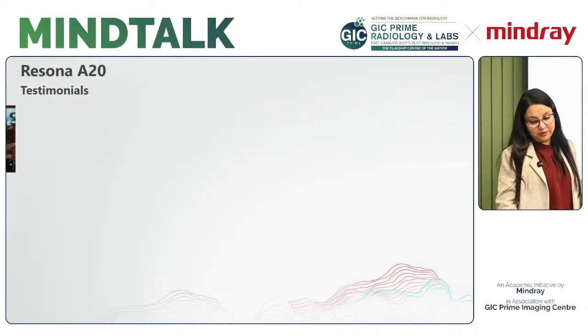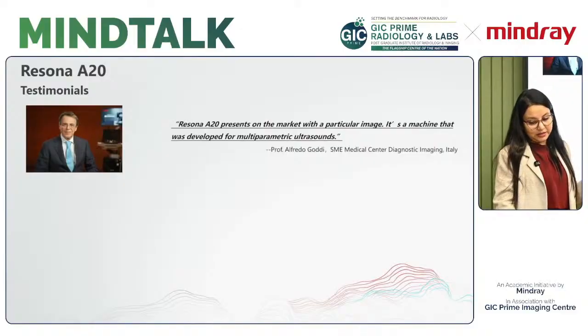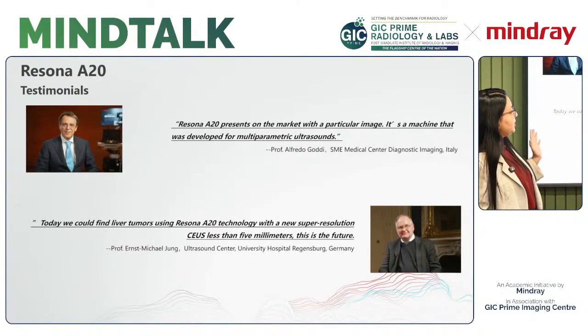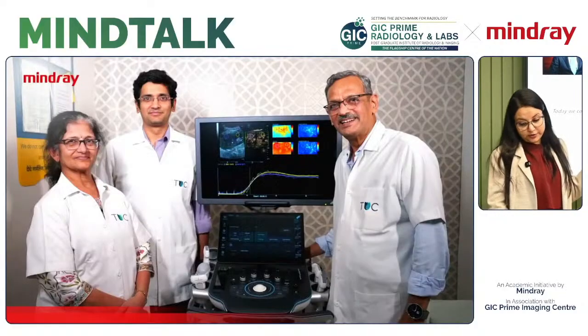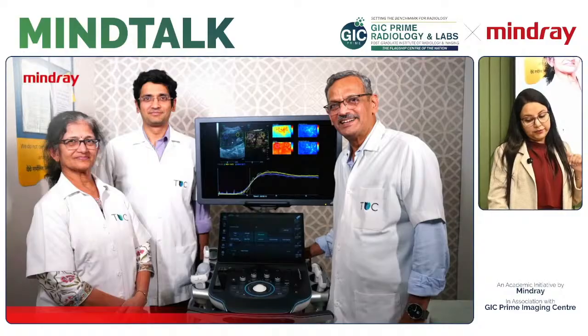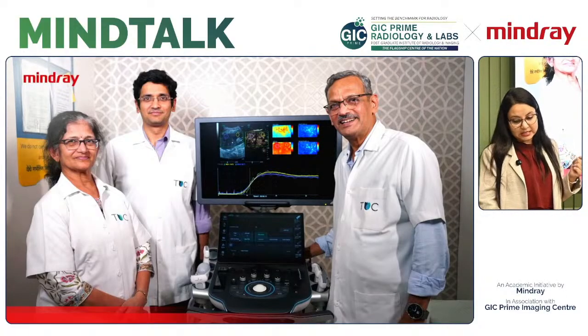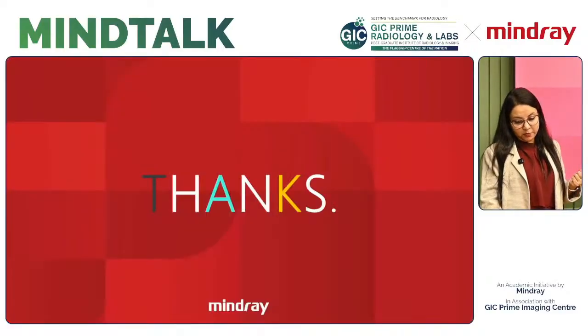So this is how the overall A20 looks, and across the world we have started selling, and there are some of the testimonials. They are very impressed with our M reference. They are very impressed with our multi-parametric solutions as well as the contrast resolutions. And in India, our first machine is also installed at Dr. Nitin Chaubal's sir's place. So that is also a proud moment for us.